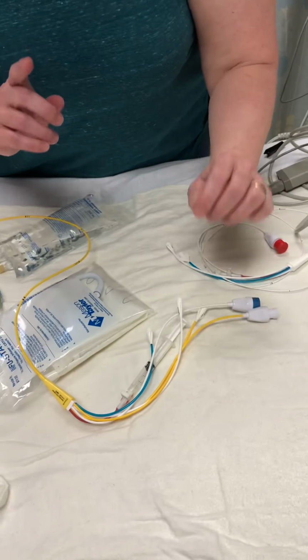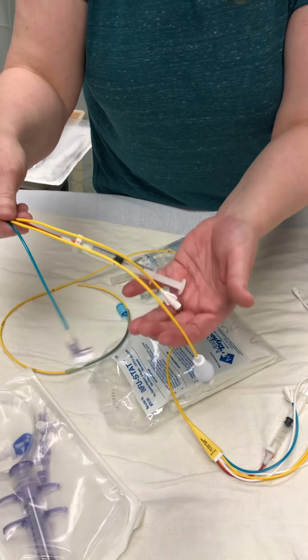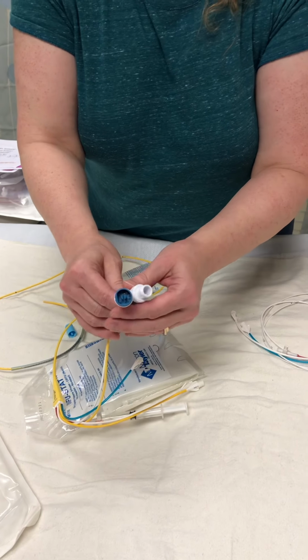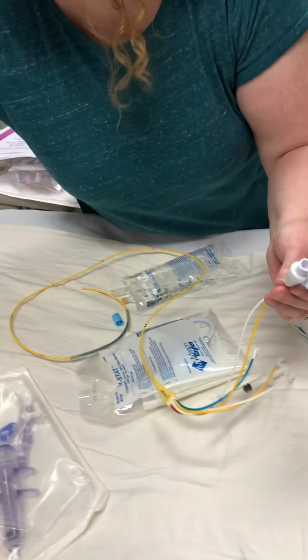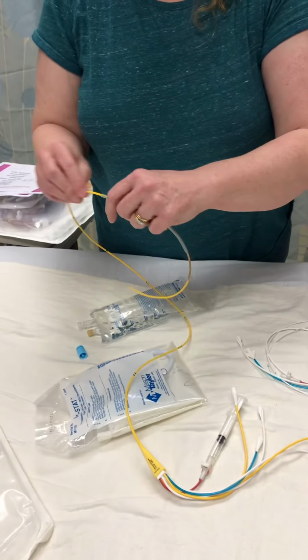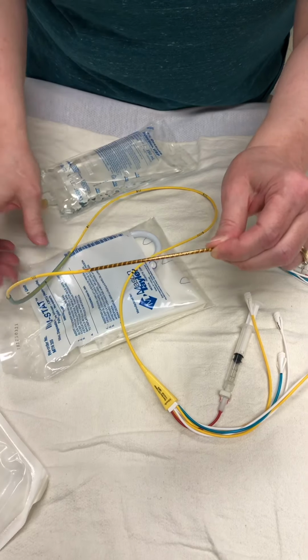In our continuous cardiac output monitors, we'll have this. In our manuals, as you can see, you're missing the white port. So in the manuals, a lot of times if you have drips, this is probably a good place to go. The other difference between the two cardiac outputs is in our continuous, you have two of these thermistor ports. In the manual, you have one. The way the cardiac output is measured in the continuous, this little thing right here, it just sends readings back and forth, and that's how you get your continuous cardiac output reading.